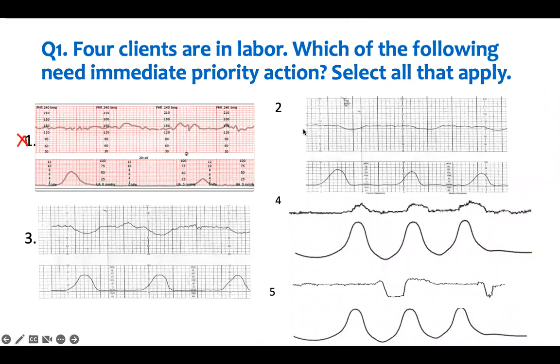Then number 2, what do we have here? You do the same thing. Look at the mother contraction. There's what? 3 contractions. It's less than 5. So that's good. On the mother side, the distance between the end of one contraction and the other is good. It's like 2 minutes. Perfect. One to another is 2 minutes. And the length of this is almost like 90. So that's good. Then you look at the peak.